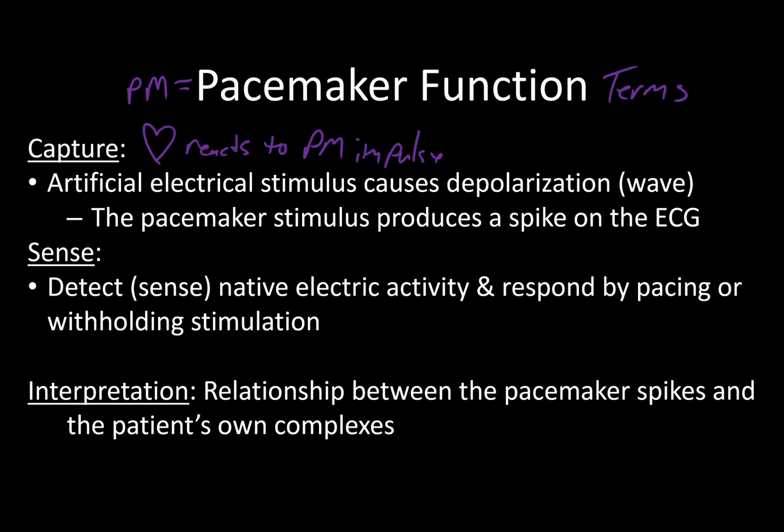Essentially, the artificial stimulus from the pacemaker causes the heart to depolarize. So stimulus, depolarization. What you should see is a spike on the ECG, and you'll know what I mean by that when we go forward. If you see a spike and then nothing happens after it, it means you have no capture.